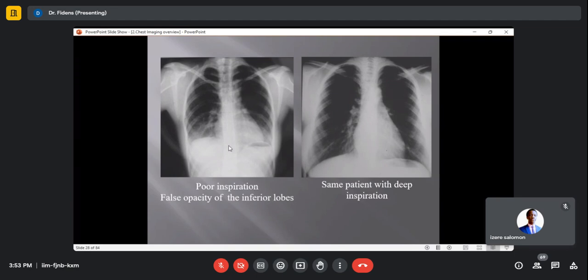But the exposure, the number of X-rays, can be checked by looking at the lungs. Like now, the lungs are too dark, meaning we have sent a lot of X-rays, but they are not intense, not powerful. Here, I will tell the technician to reduce the mAs, the number of X-rays, but he doesn't have to reduce the kVp.